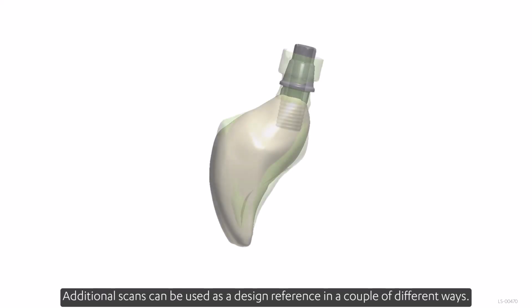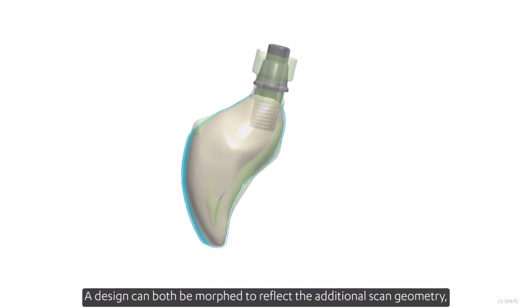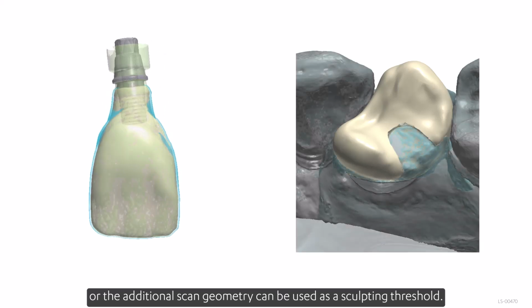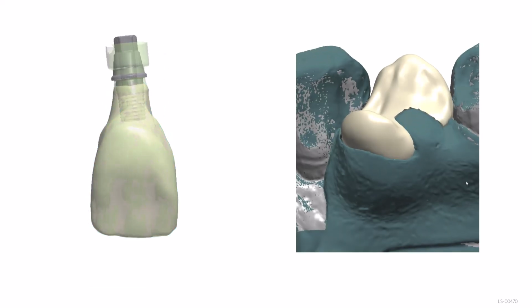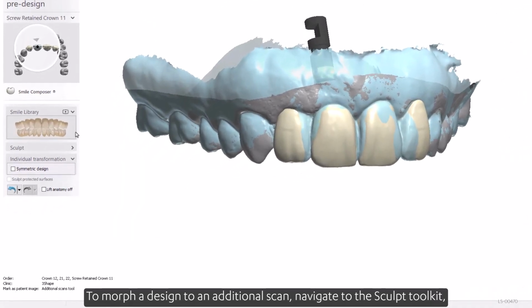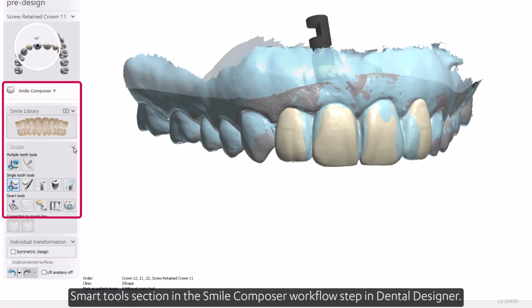Additional scans can be used as a design reference in a couple of different ways. A design can both be morphed to reflect the additional scan geometry, or the additional scan geometry can be used as a sculpting threshold. To morph a design to an additional scan, navigate to the Sculpt Toolkit, Smart Tools section in the Smile Composer workflow step in Dental Designer.